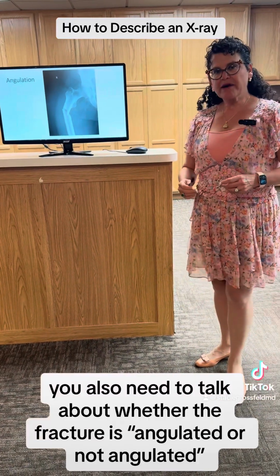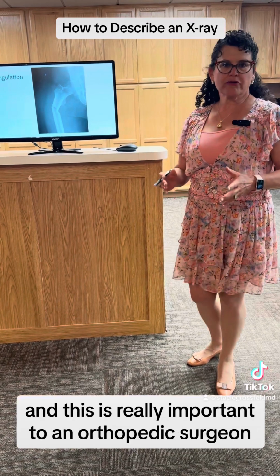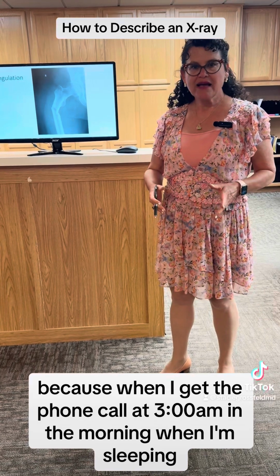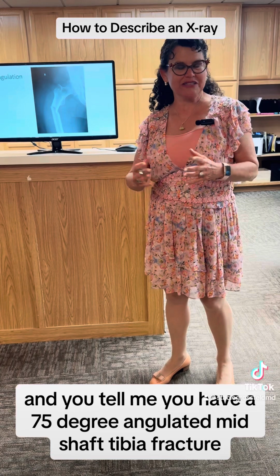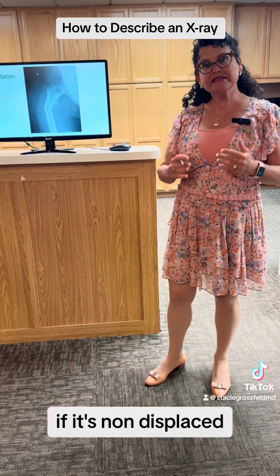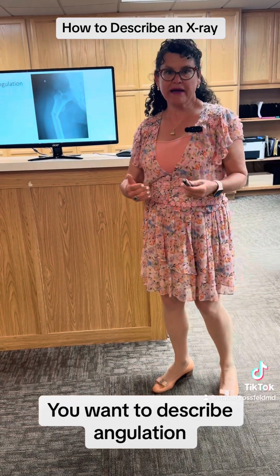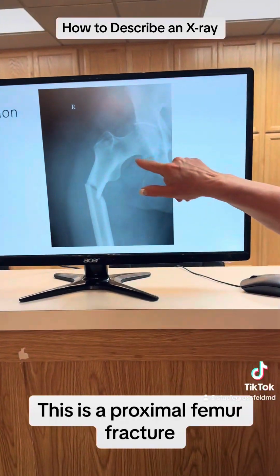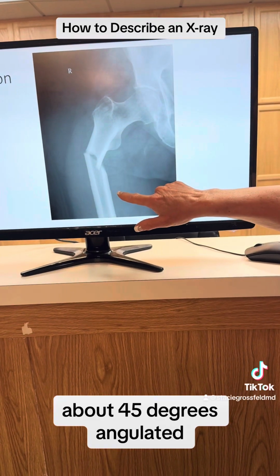You also need to talk about whether the fracture is angulated or not angulated. And this is really important to an orthopedic surgeon because when I get the phone call at 3 a.m. in the morning when I'm sleeping and you tell me you have a 75-degree angulated midshaft tibia fracture, that means I'm getting up out of bed coming into the ER. If it's non-displaced, that's something you can splint and put on ice. So you want to describe angulation. This is a proximal femur fracture, about 45 degrees angulated.